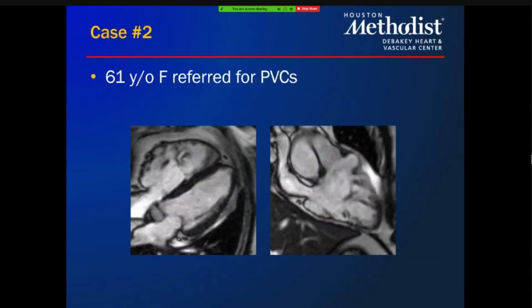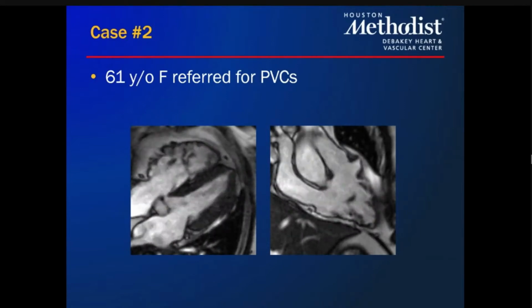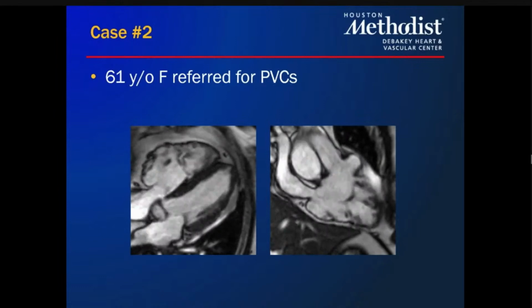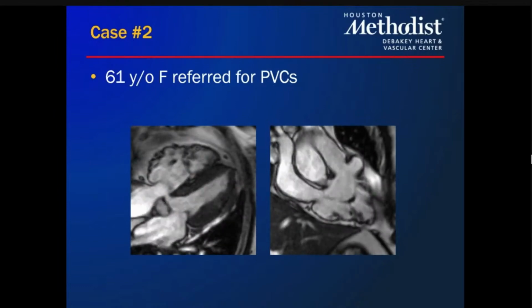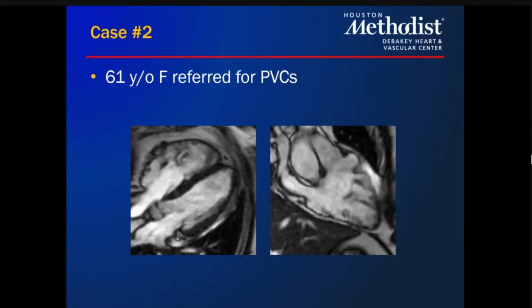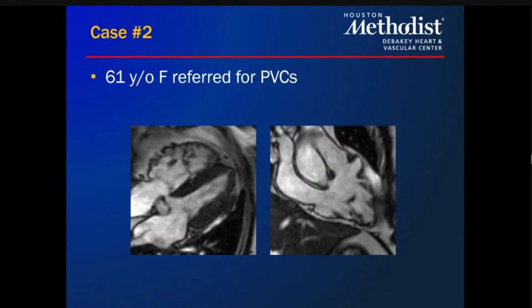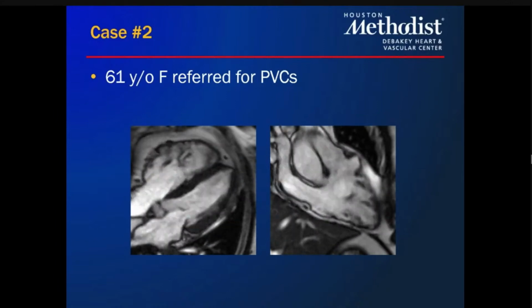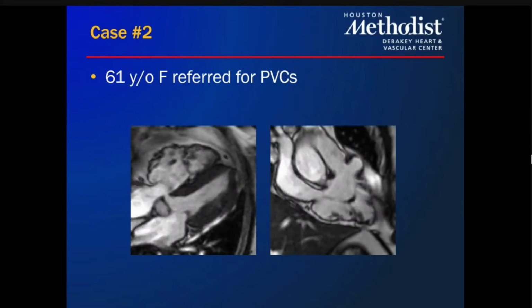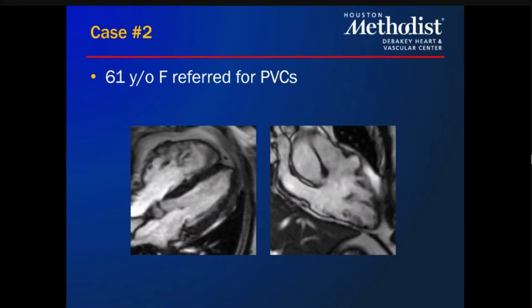Moving on, this is a patient who has a history of PVCs. Actually, some of you may know her. She works with us, but she had PVCs a lot. Some unexplained dizziness every now and then. And one of our former CMR fellows finally got to capture images on her when her heart was cooperative.